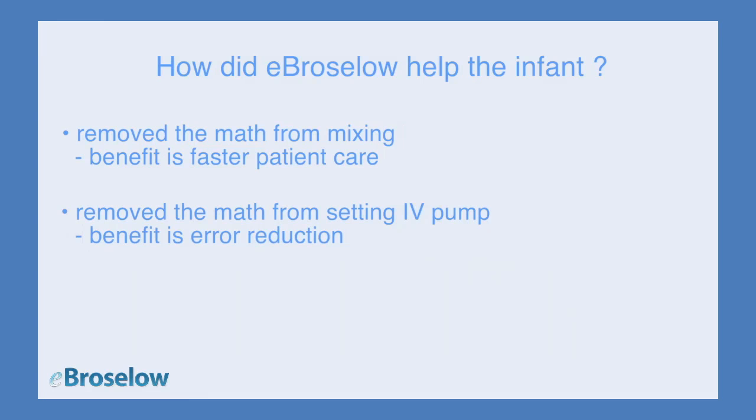eBroselow showed the nurse how to program the IV pump rates. The nurse did not have to mathematically calculate the correct mLs per hour for the IV pump when increasing or decreasing the dose. The benefit is that potential errors were reduced.